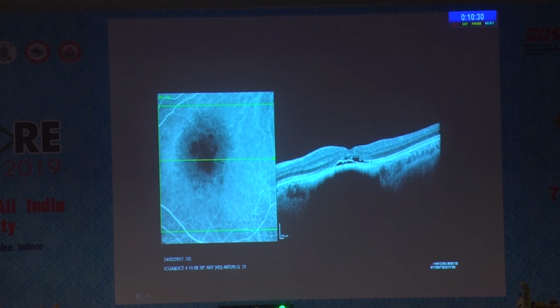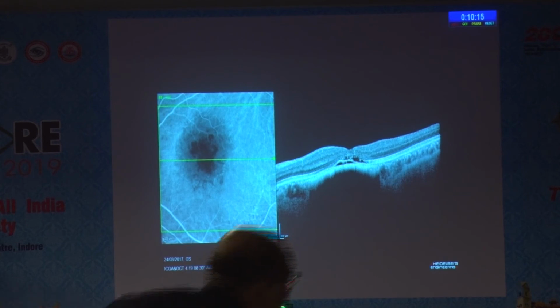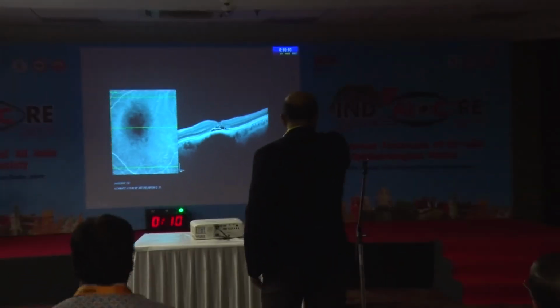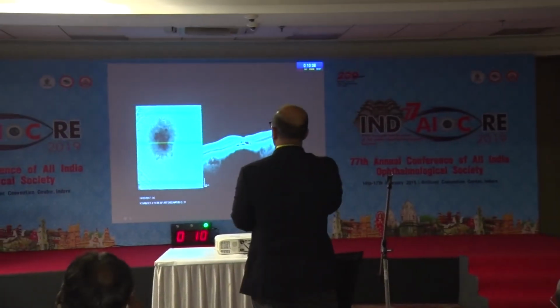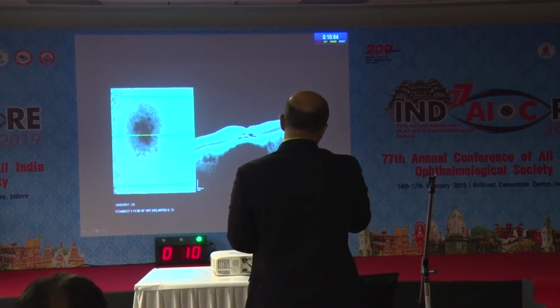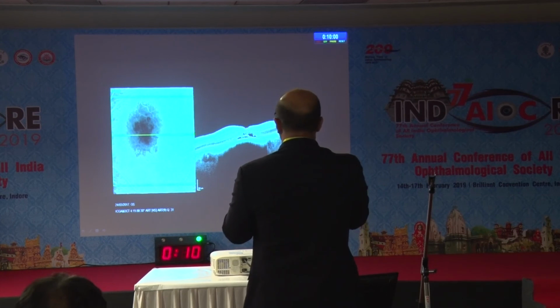Okay. So now, you had to put that in. So everything's going pachychoroid, perfectly according to cue. Okay, neovasculopathy. Now things change a bit. Many times I've noticed that some of the occult membranes don't highlight on ICG, and you might pick it up on OCT and you treat it and it responds. It will not be evident on ICG.